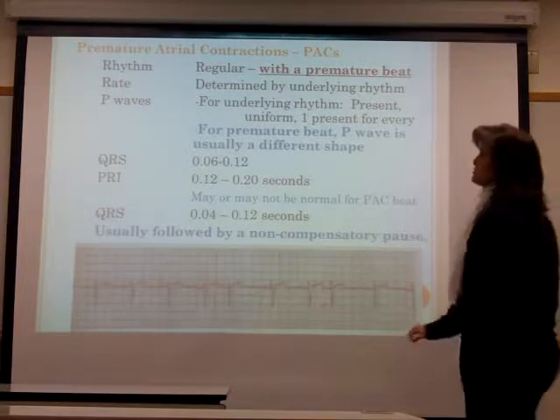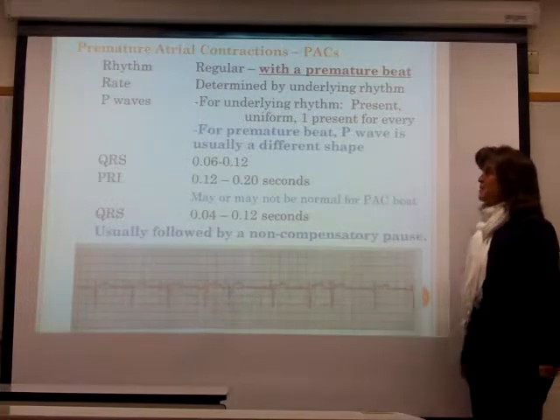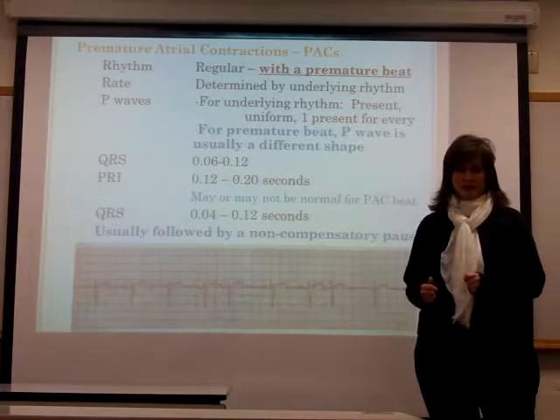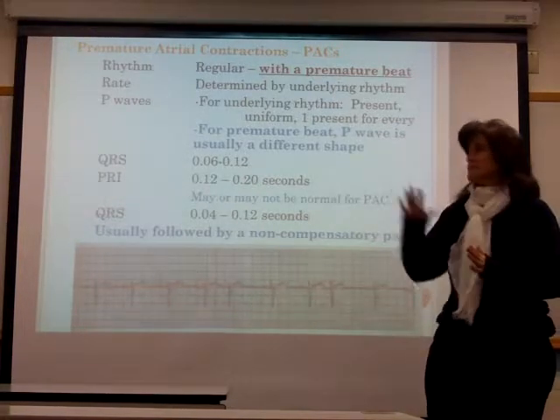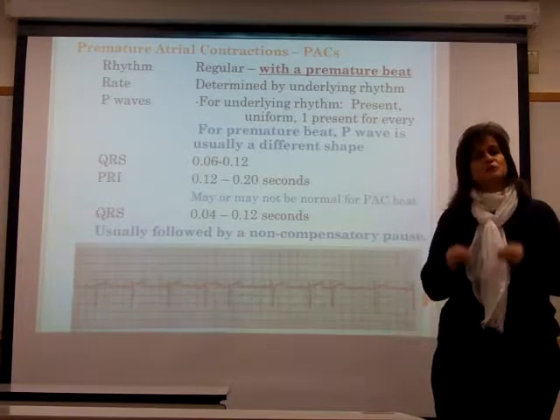Okay, this is the first of two atrial dysrhythmia slides or videos that we're going to talk about. The first one is what's called a premature atrial contraction. One thing you have to know about a premature atrial contraction is a PAC is just an anomaly. It is not the underlying rhythm.